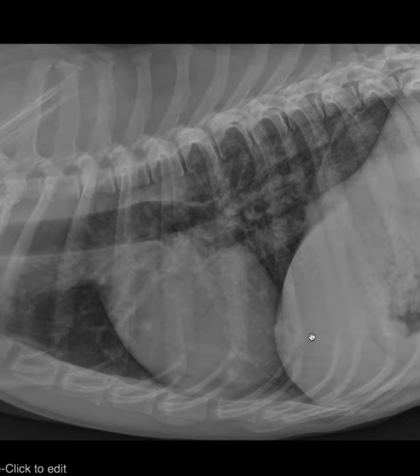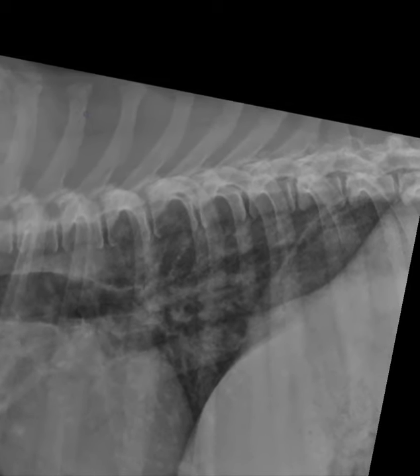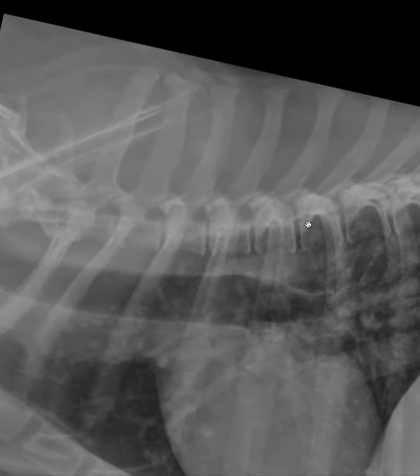Well, I definitely, in a case like this with T3-L3 signs, I would really amp up my assessment of the vertebral column. I do this routinely in every case, but I want to use this as a way to go through what my process would be, okay? The vertebral column has some complex anatomy. So I like to approach it in stages, and on the lateral view, I find I can see things better.